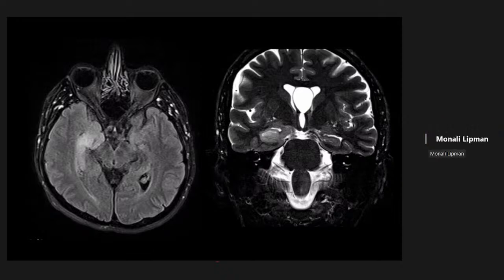It looks edematous, and again that increased T2 signal. So tell me what you think. I think I'd be concerned for a temporal lobe epilepsy, especially with the distortion of architecture and the increased signal. I'd be thinking about mesial temporal sclerosis maybe.